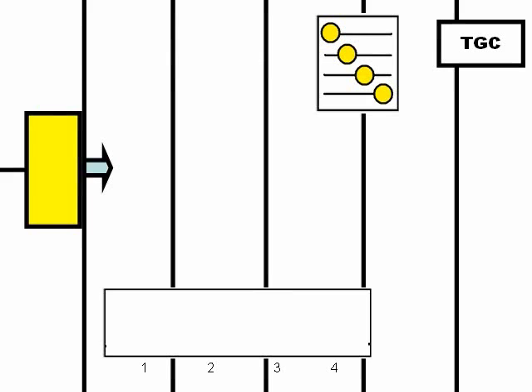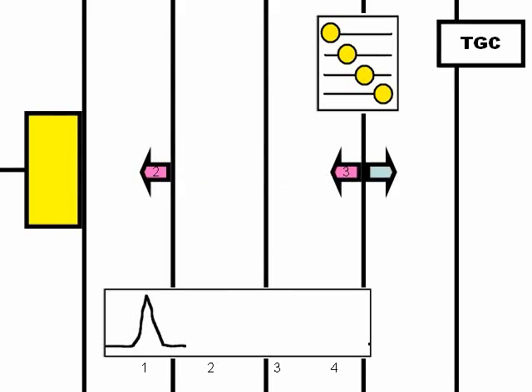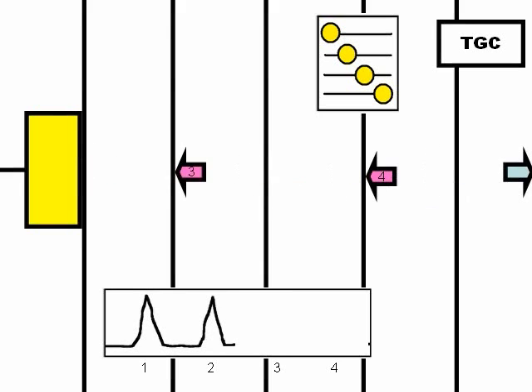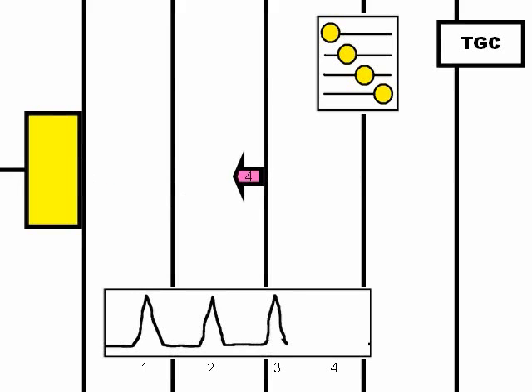In this case, this is the same example of how the amplitude of the echoes is produced. One echo was produced, second echo, number 3, number 4.